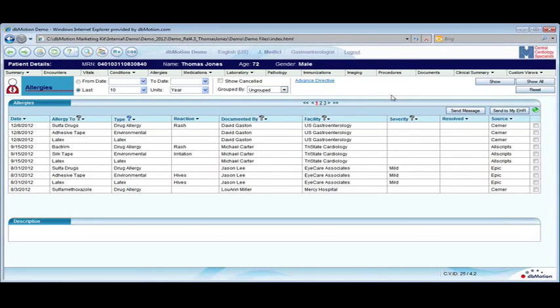This is both the problem and what I would say is the solution to that. And for those of you who haven't seen this before, this is a real live HIE-driven allergy list. It is 3 pages long, and it is one of those things that clinicians, when they see this, immediately say, I'd rather have no information than to see this, for a couple reasons.